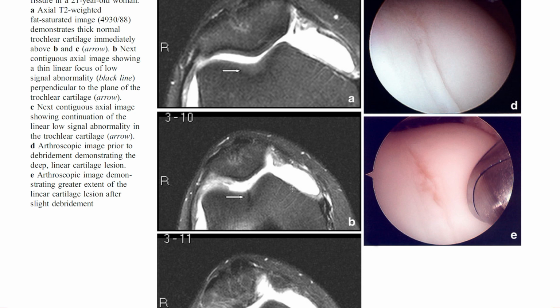But it's not always the case. Often you have this sign here, but the arthroscopy or the surgeon reports that the cartilage is looking fine, and some authors argue that the superficial layer might still be intact. So you might wonder, why is it dark on a T2 weighted or fluid sensitive weighted sequence? If it's a fissure, shouldn't it be bright or hyperintense?